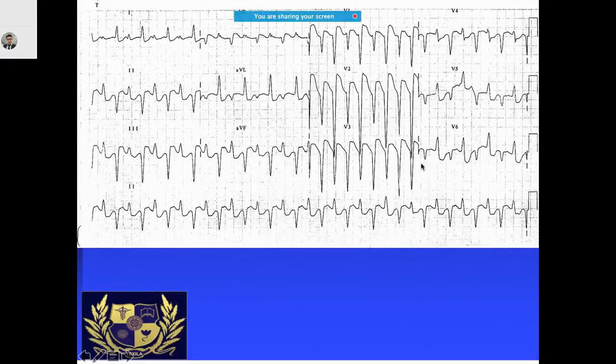And mostly, although it seems like... what is happening? So if you look carefully, especially in lead 1 and 2, the axis is changing on alternate beats. So this is what is called a rare form of ventricular tachycardia, which is characterized by beat to beat alteration of the QRS axis. So the QRS axis shifts 180 degrees, literally from left to right with each alternate beat. So this is what is called a bidirectional ventricular tachycardia. Okay?